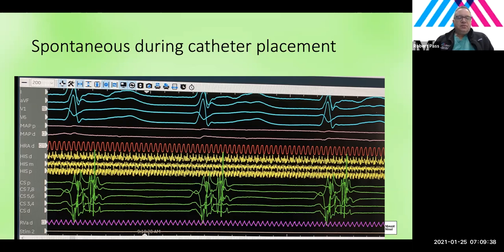Now, the interesting question is, why is the tachycardia rate only about 150? My suspicion is that the pathway doesn't conduct terribly well retrograde. And that may be just the natural quality of this particular patient's pathway. But it might also be that because of the prior ablation attempts, injury to the pathway may have been sustained, which is causing it to conduct less well.